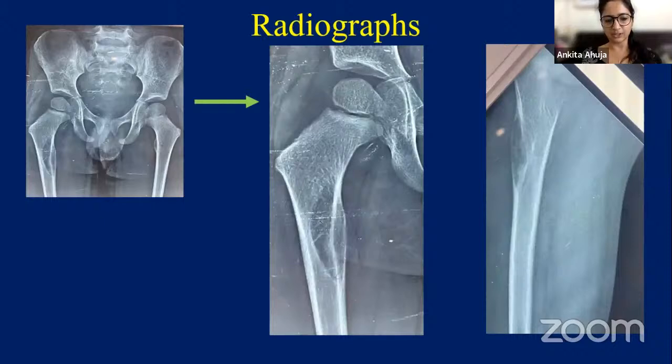I'm not really thinking of a very aggressive etiology. Just that the location is almost at the level of the lesser trochanter, which makes it a little lytic area in the lesser trochanteric region, so it is better to get a further evaluation, is what I think.